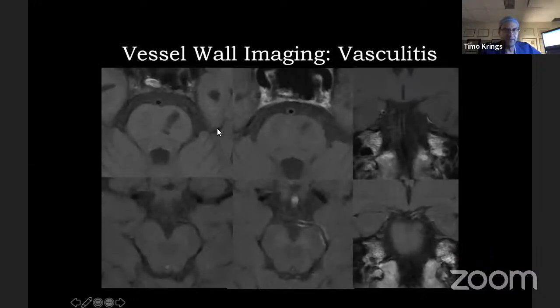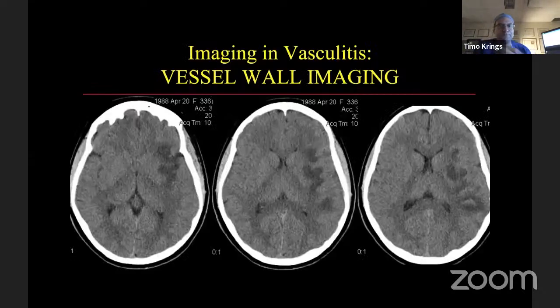Another example here, pre-contrast, post-contrast. This was an 18-year-old boy who presented with a pontine perforator ischemia. You do not think about atherosclerosis in pontine ischemia in this age group. And if you see concentric enhancement of the basilar artery or the posterior cerebral artery here or here, then you know that this patient's diagnosis is vasculitis.